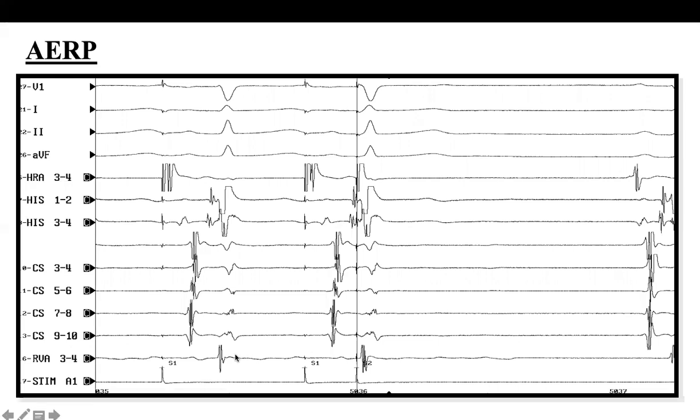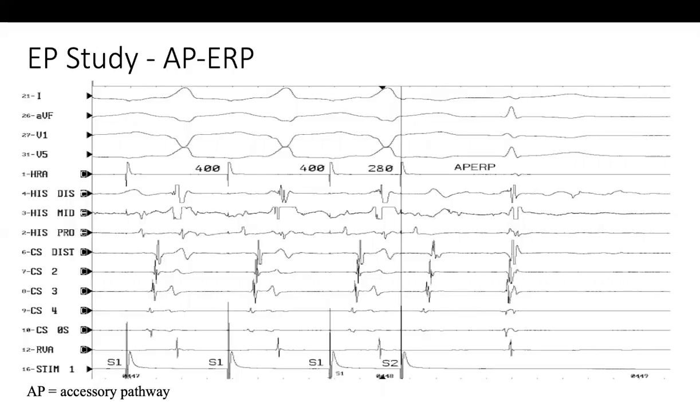First, you cannot, because here we don't have any numbers that we can rely on to start with. We cannot, because it is possible the paper was stretched and the rate is very fast. That's number one. Number two, this is a paced rhythm, paced atrial. So in the paced atrial, we cannot call this a first degree AV block because that might be a physiological response to certain numbers. I might induce this in anybody who is normal.